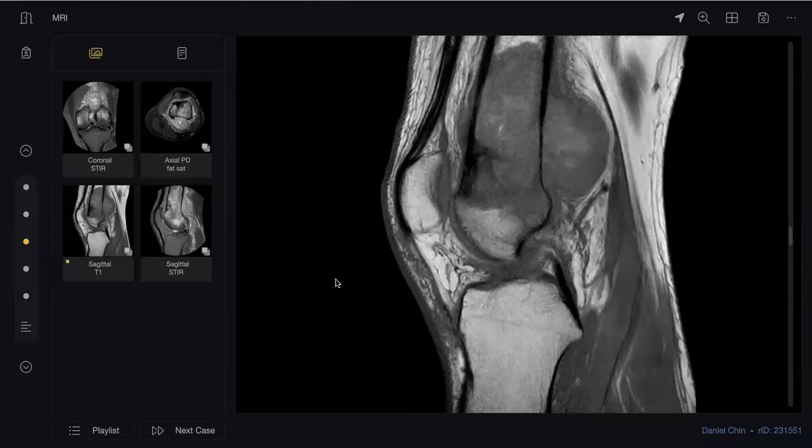No bone scan also? You'll do a whole body MRI with diffusion weighted image. If you do not have FDG PET in your town, you can do a whole body MRI with diffusion weighted image to look for distant metastasis.